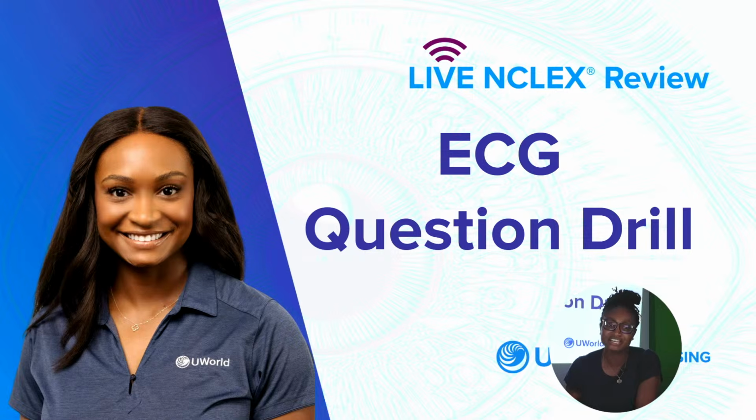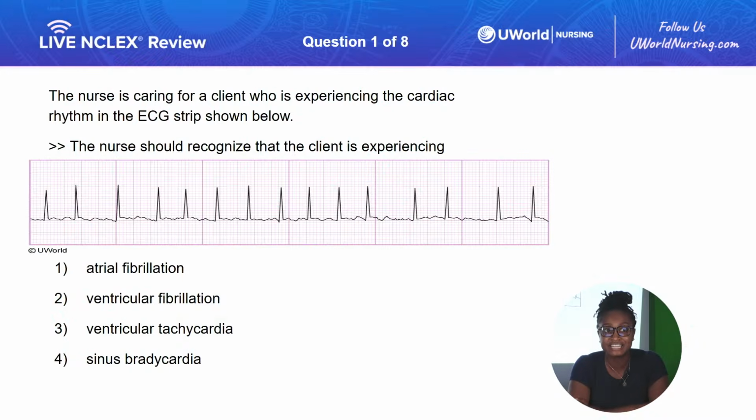Let's get started. Question number 1. The nurse is caring for a client who is experiencing the cardiac rhythm in the ECG strip shown below. The nurse should recognize that the client is experiencing what? Is it option 1, atrial fibrillation? Option 2, ventricular fibrillation? Option 3, ventricular tachycardia? Or option 4, sinus bradycardia? Let me know what you guys think in the chat that this rhythm is.